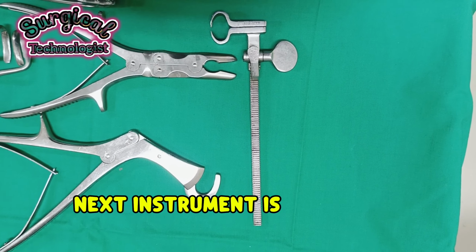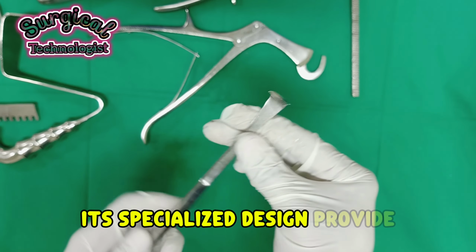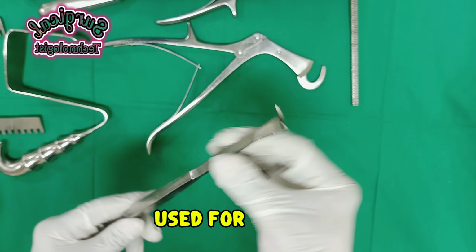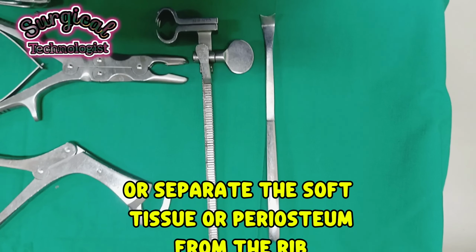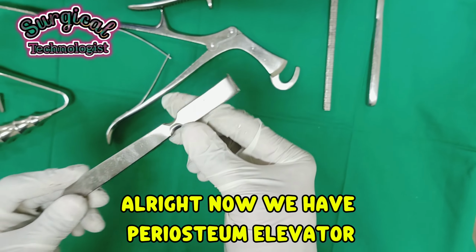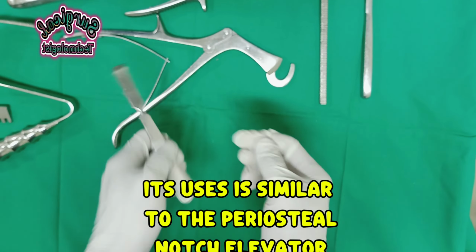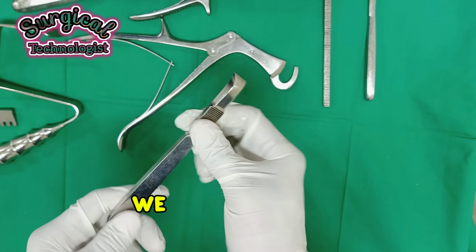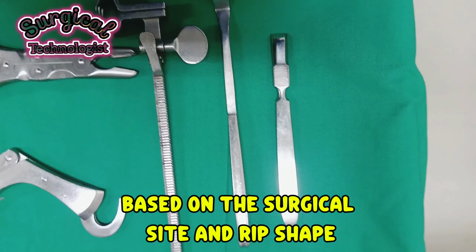The next instrument is the periosteal notch elevator. Its specialized design provides clear surgical access to the rib, and it is used to scrape or separate the soft tissue or periosteum from the rib. Alright, now we have the periosteum elevator. Its use is similar to the periosteal notch elevator, but the difference lies in their shapes. We choose one over the other based on the surgical site and rib shape.